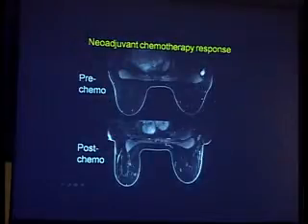Here is a clip with the node, and this is a clip of the parenchyma after the unsuccessful ultrasound-guided core biopsy. This is the port. Remember, she is going to be on the contralateral side now in patients going on neoadjuvant chemo. So does she respond well?